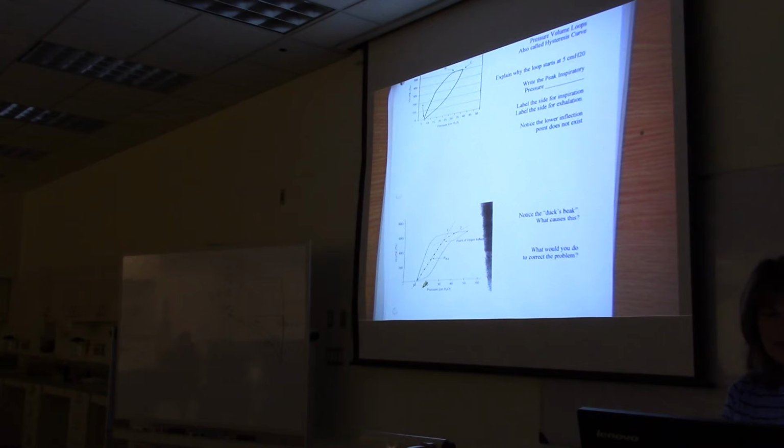All right, so initially you see a lot of pressure going into the lungs, but not much volume. Then all of a sudden volume starts going in. So now the alveoli have opened up and now they can fill with volume. And so you'll see the volume going in. I'll give that to you in the notes a little bit later.